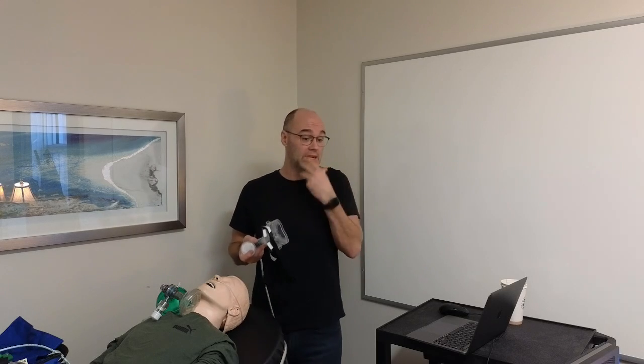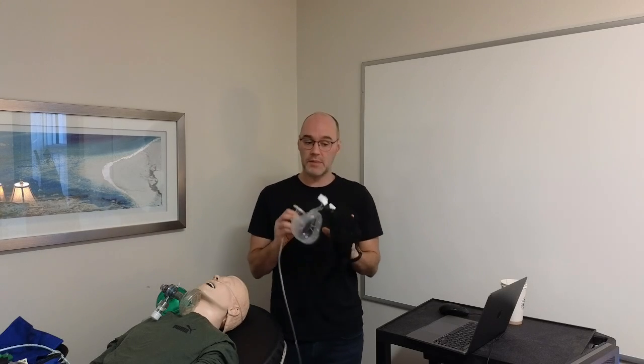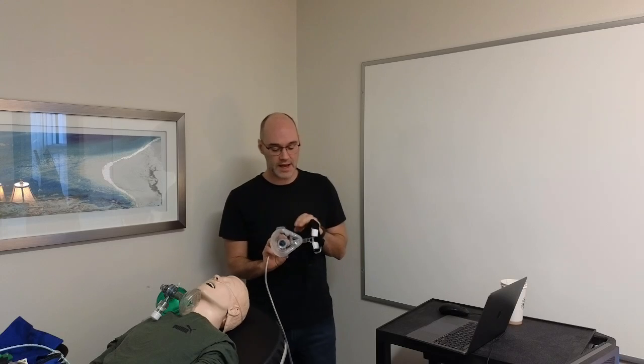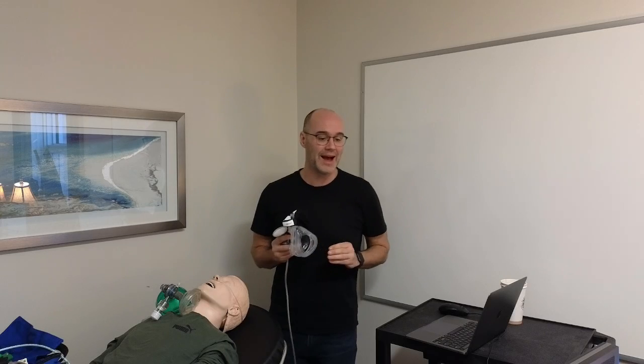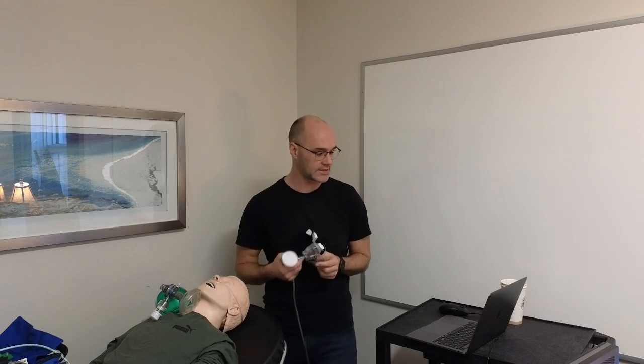Now, this will also help a patient with sleep apnea by splinting airways open. This has become very prevalent as more and more patients have sleep apnea. It helps splint their airways open while they sleep, so those soft tissues in the upper airway don't collapse and cause an airway obstruction, and they stop breathing and then wake up and do that cycle over and over again.